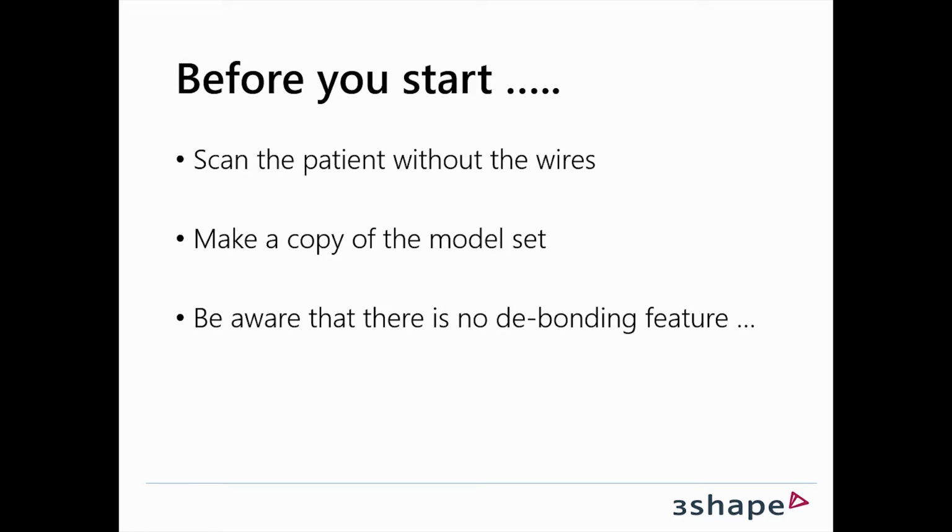And thirdly, be aware there's actually no debonding feature in the ortho system, and you may think this is strange having a video about a feature that doesn't exist, but actually we're using an existing feature in the ortho system for doing debonding, and Rikke will show you just in a minute how that works.